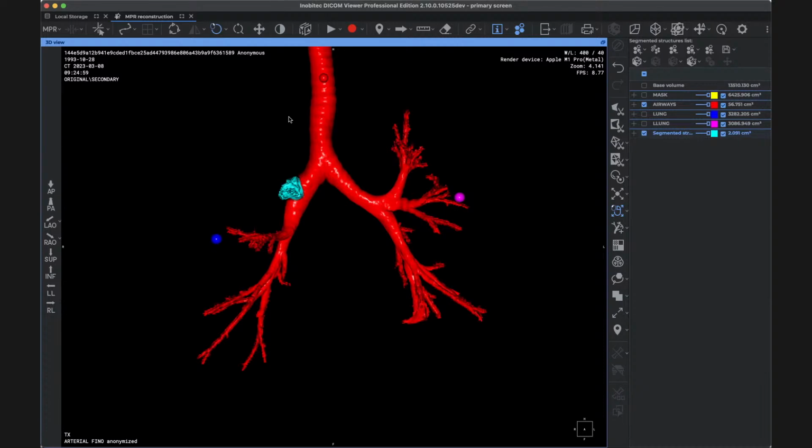The lower the intensity on the lower threshold, the fewer structures, and the less lung you get inside your image, because lung has a higher intensity than the trachea itself. So I think that for the airways, around negative 500 to negative 300 is okay, it's good.